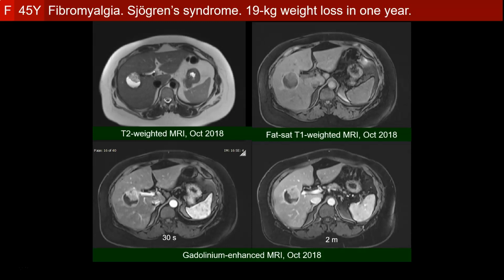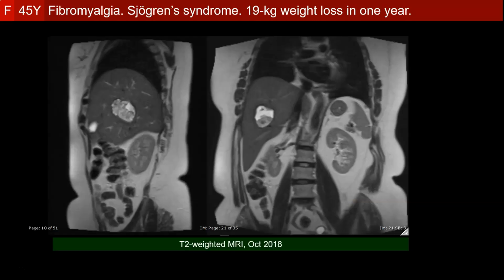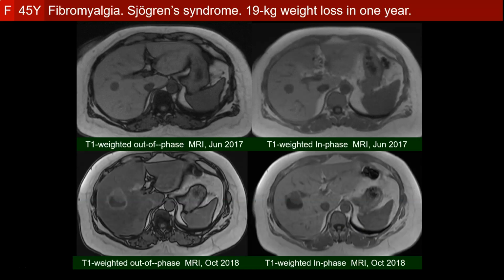The second feature is the enhancing rim at the periphery of the lesion. There is diffusion restriction in the solid component of the lesion. And here we see the cystic and the solid components. And the patient has developed a fatty liver in the interval, because on the previous MRI, as we see here, the liver was not fatty.